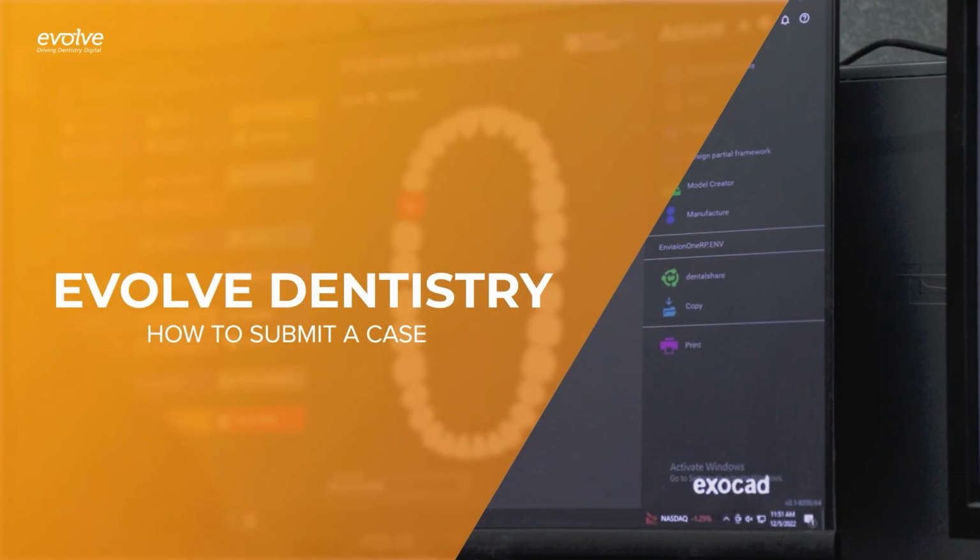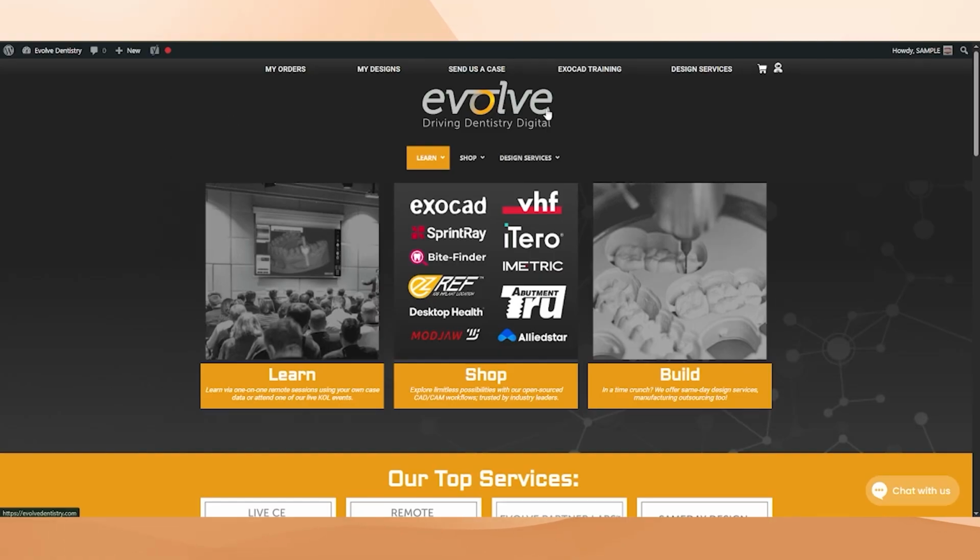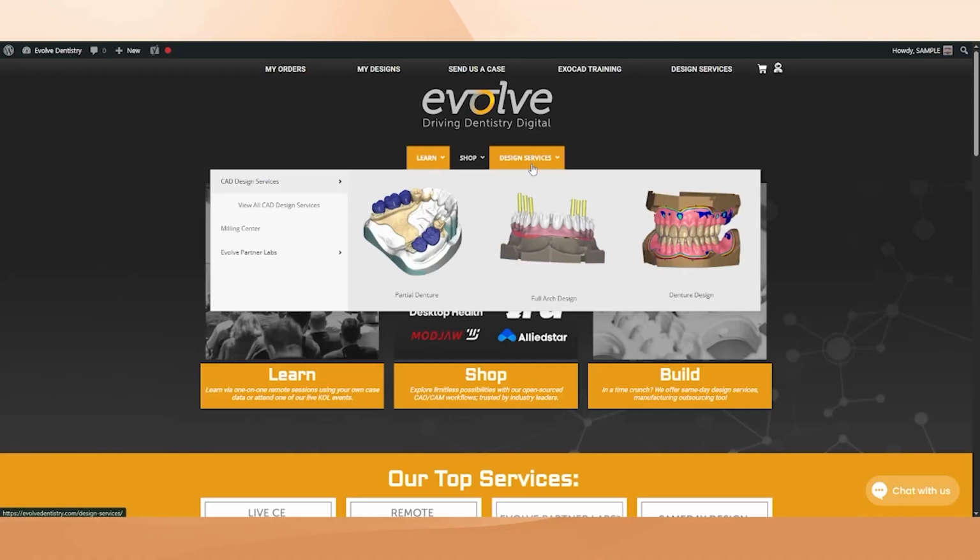Here is a step-by-step guide to easily submit your case using our online portal. After signing into your account, head to the Design Services drop-down menu to start a new case.